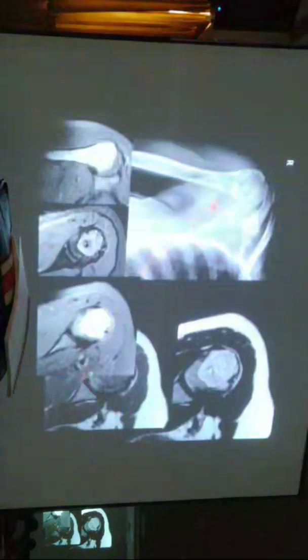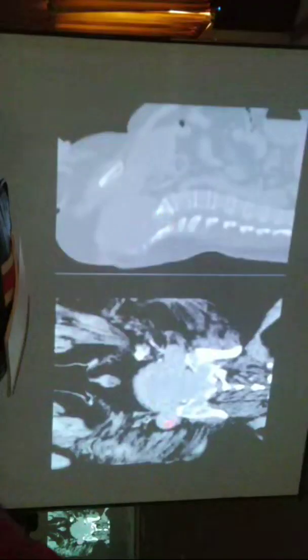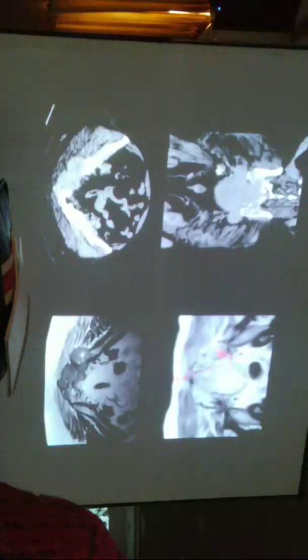Sometimes MRI can be used as a problem-solving tool. For example, you have a humerus lesion. On MRI, it's appearing very hyperintense on T2. So this is a chondroid lesion. While this lesion, again a sacral lesion, is a large lytic lesion with soft tissue. This is again a similar lesion. So what are these two cases? This is very hyper on T2. This is hypo on T2. So this we saw earlier. This can be either a chordoma or a chondrosarcoma. Both are T2 hyperintense, while a GCT is T2 hypointense. This is GCT. So this is a problem-solving aspect of MRI.